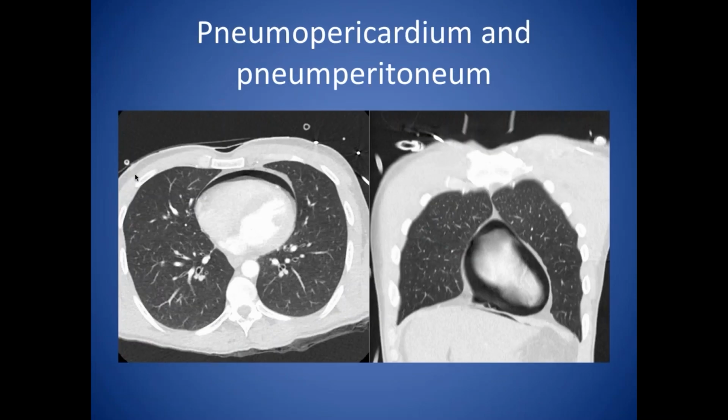Here's another example of pneumopericardium. This time, the patient has also got a pneumoperitoneum. Apologies for the spelling. And this was trauma associated.